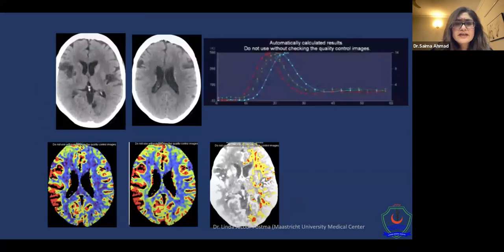This is again a case in which the patient had a stroke and went back home with a normal CTA. And you can see the stroke is on the right side when the patient came back and had the CTP. There was some kind of seizure going on, so it was picked up like this. These kinds of problems you may encounter in your daily life during CTP interpretation, and you must be aware of all these.